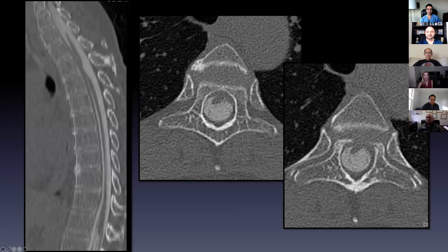Here are our axial images. This thing is the cord up here in the front. Normal, homogeneous contrast. There is no mass behind the spinal cord in the canal. So it's not being pushed forward. It's being pulled forward by something. So is it an arachnoid web or spinal cord herniation? And this goes back to the original poster's question. I would say in this case, it's coming all the way up to the dura in the front. We don't see any CSF in front of it.